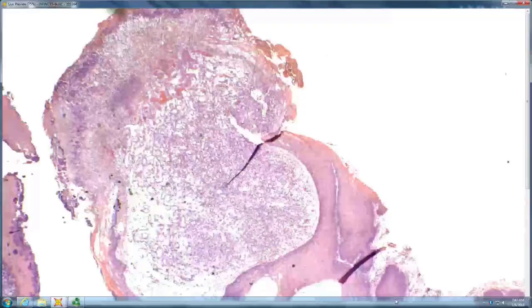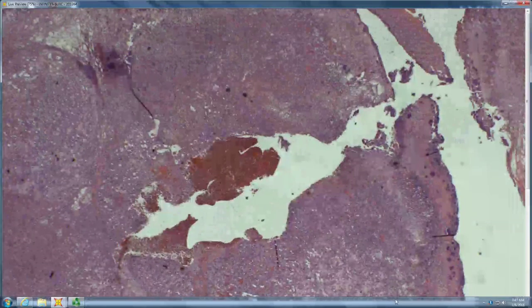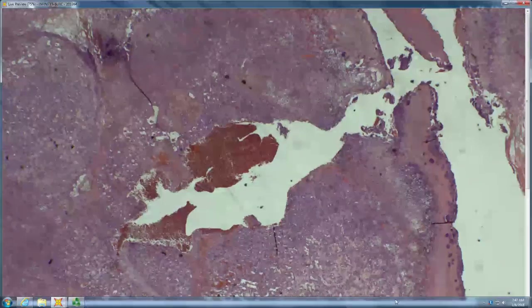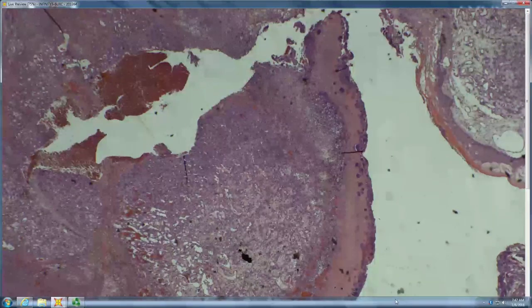Okay, David. So, a lot going on here. It's almost like lobulated, almost like really vascular appearing. So you said lobulated, vascular. What does that make you think of? Like a pyogenic granuloma. And what's on the surface of this eroded PG? What are all of these big purple circles?